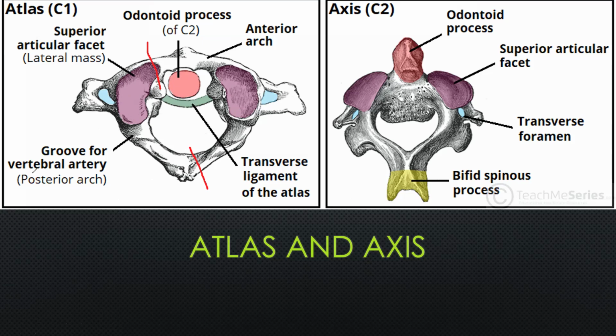Once you've got your fracture lines happening over there, this section will start to move in that direction, and this section will start to move in that direction. It's the exact same thing for C2. If C2 has a fracture, for example, let's say running through there, it will likely run through there as well, or it may even fracture in another area. But I'm just trying to make it easy for people to understand. Once you have that fracture, these pieces start to move away from the central area. And that's when you get this picture like what you're seeing in our fracture over here.